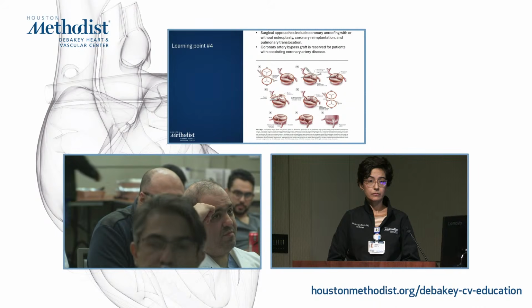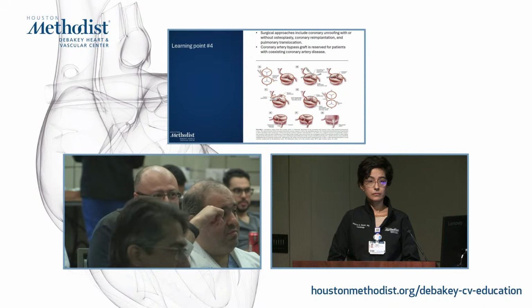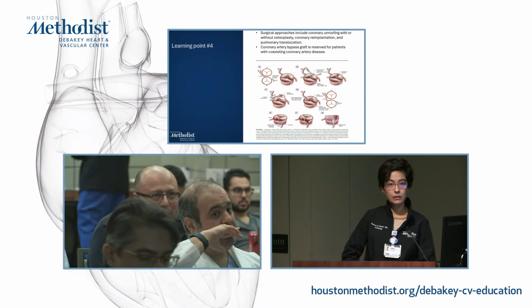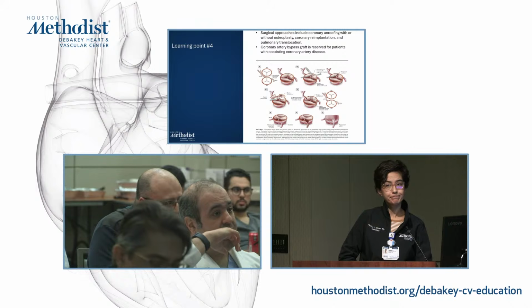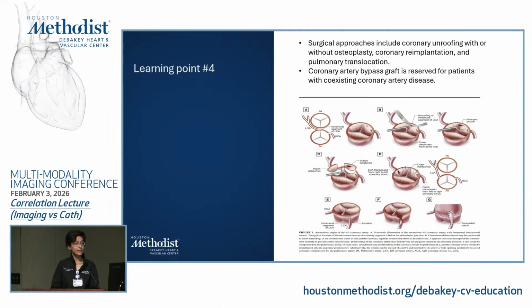It's probably related, but again, we couldn't prove it even by perfusion imaging. We don't have blood flow measurement to detect it earlier than perfusion. Did they try the medical therapy? They already tried beta blockers, but because of the persistent symptoms, they ordered CTA.